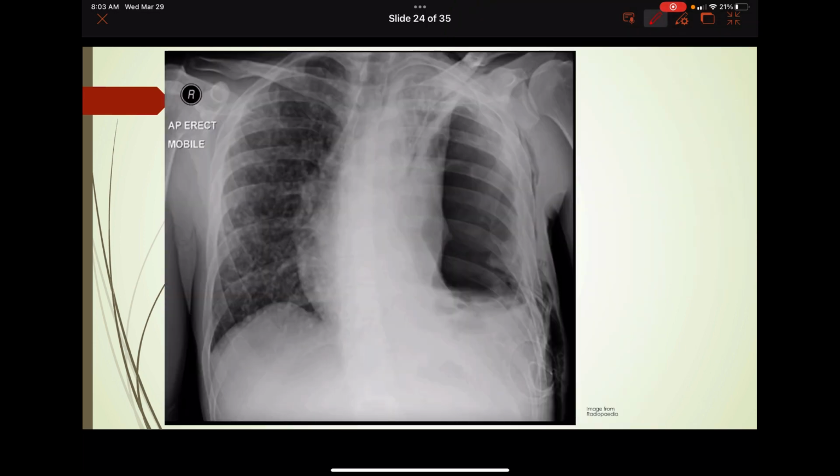And chest x-ray, A for airway, trachea coming down here. Carina looks about right there. But it looks like this is shifted over a little bit. You can see here's what looks to be midline coming down here. You can kind of see it shifted to the patient's right a bit.